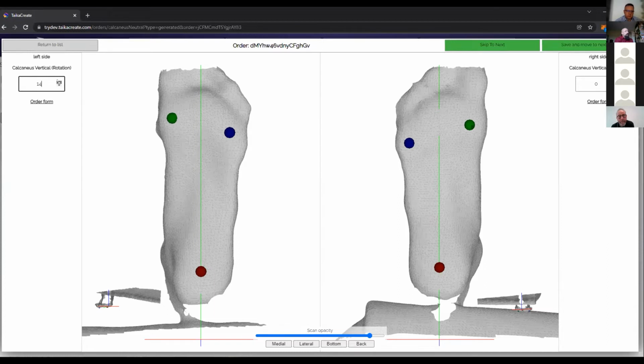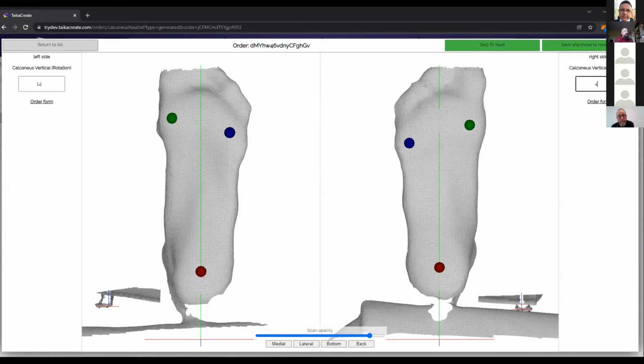Obviously here the position needs to be corrected quite a lot, and all this extra surface which is connected here doesn't really help. But once you're satisfied with the alignment or your landmark locations, so these were identified automatically, but you can tweak the alignment by hand.